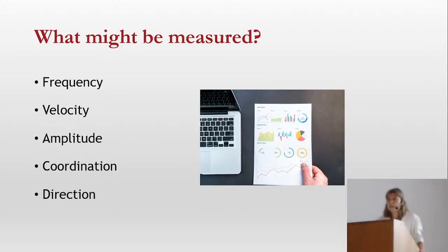Yes, in the ultrasound speckle tracking, they can measure all of this, and this is what I want. I want to be able to see the frequency, velocity, amplitude, contractions, coordination, and direction. It's true that you can see the direction and coordination more or less, but as I told you, we need more.